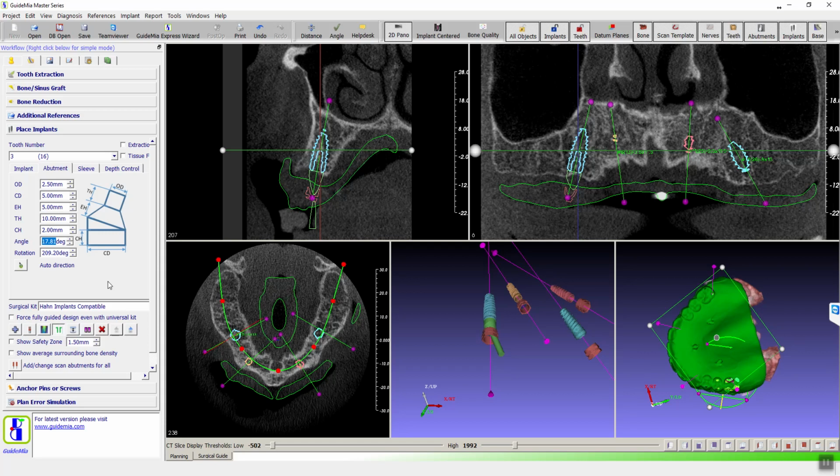Frank, kind of what we do, at least when I do it, is I can pretty much guess a 17 or a 30, and then you spin it around and move it around until you get it where you want it. Because it's kind of a combination of implant placement and abutment angulation. I don't know that I want to mess with the custom dimensions there, but I see what you're getting at. But I think we've only got 2 choices, or 3: straight, 17 and 30.